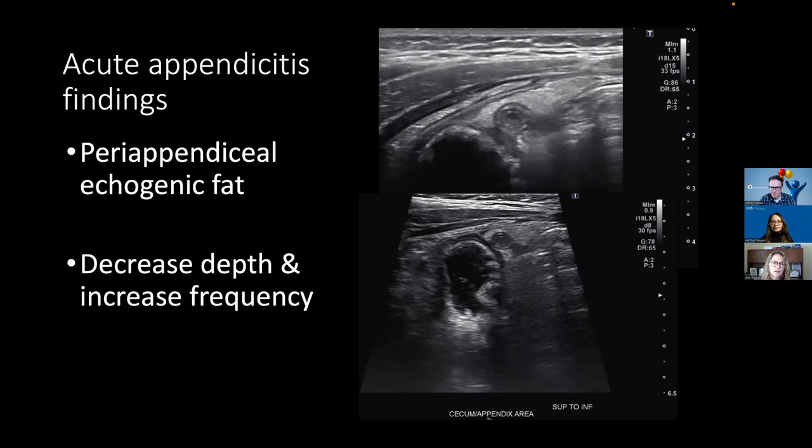Yeah, I agree. And I love the cines. On the cines, you don't just include the periappendiceal mesenteric fat. So even if our tech finds the appendix, they get screening images of bowel elsewhere, and exactly the same way, we compare the mesenteric fat elsewhere to what's happening right around the appendix. So Judy, do you do cine clips with screening of other bowel as well, or just a still image like on the left lower quadrant?